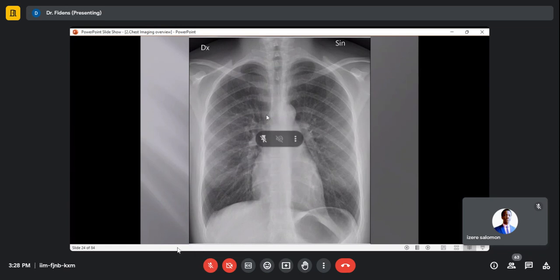And who can count the posterior ones for me then? Yes, count and tell me the number. I will know whether you know how to count or not. It's 9. They are 9. No, they are 7. Seven. They are not 7. Look. Can you see my cursor? Look.